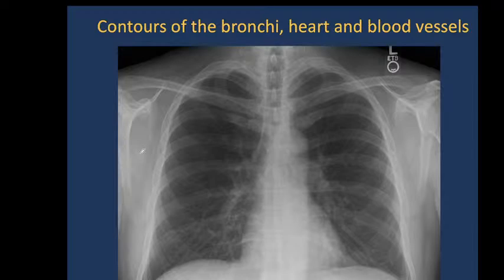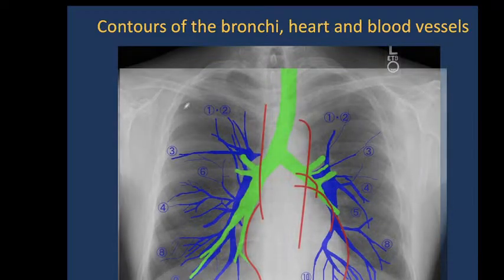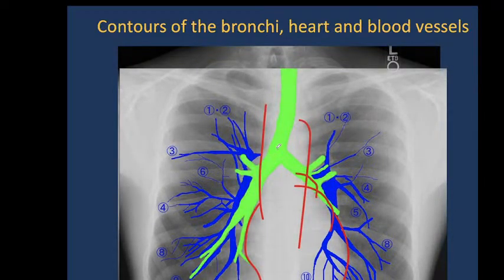Very often doctors try to evaluate contours of the bronchi, heart and blood vessels, and it is easy when you know such locations.